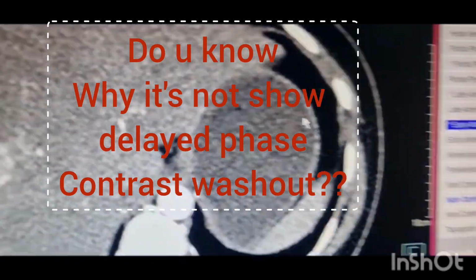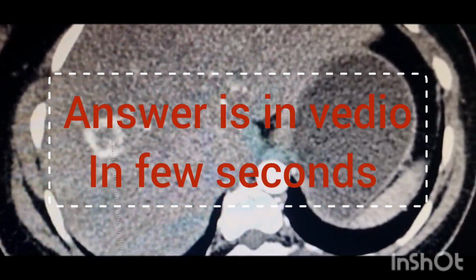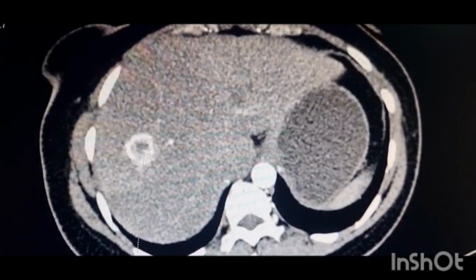As we see here, this is in early arterial phase. That progressively becomes centripetal filling, and enhancement persists, that is, contrast does not wash out in delayed phase.